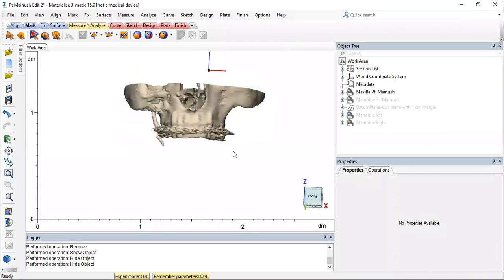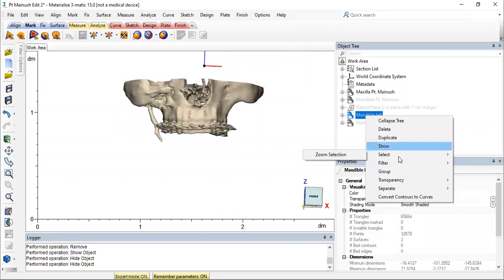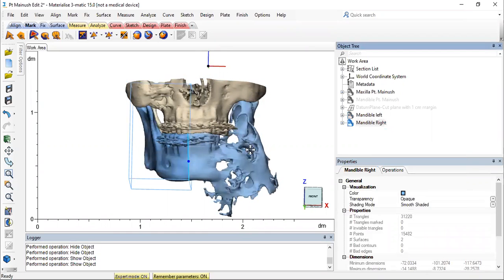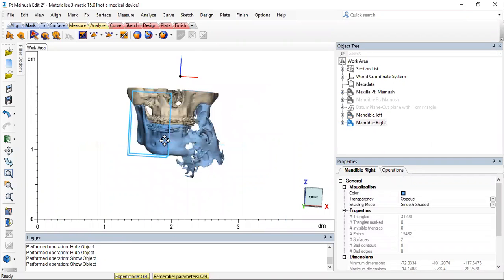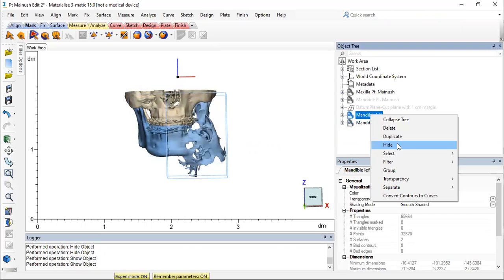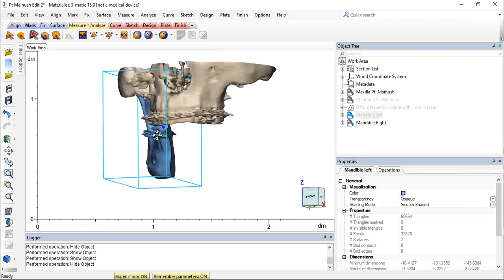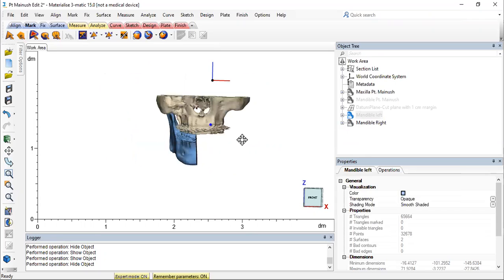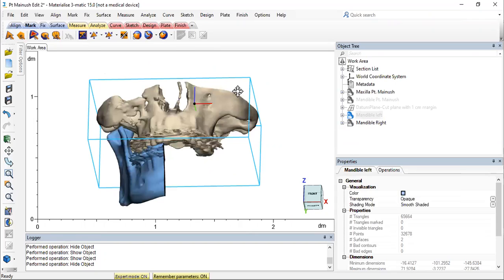So yes, coming back to this, yesterday we had completed the surgical guide, wherein from that we came to the conclusion that this is going to be our cut, and we will have to remove the condyle section as well, right? So after taking the cut, we will have this much section of the mandible remaining, right? Now we have to reconstruct or design a PSI for the resected bone. So here this also involves that we have to design the condyle.